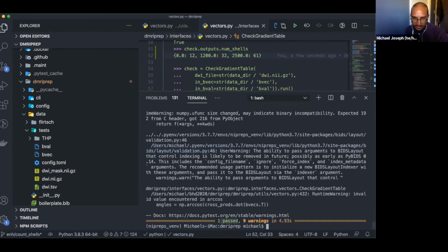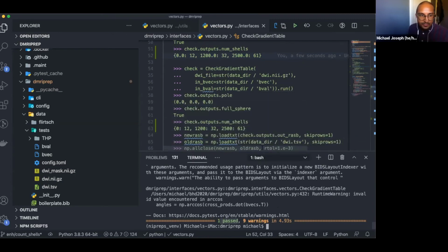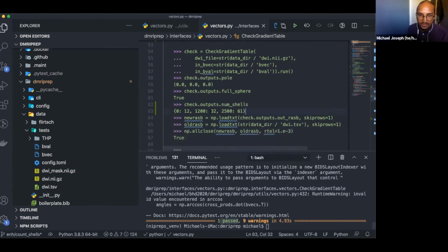And so yeah, our tests passed. So now we're good to go. So I talked about, as a next step to this workflow, what you can do is integrate this output into the QC page, but that's a more advanced workflow. We'll end off right here. I'll show you how to add your changes and push them as a pull request to GitHub.